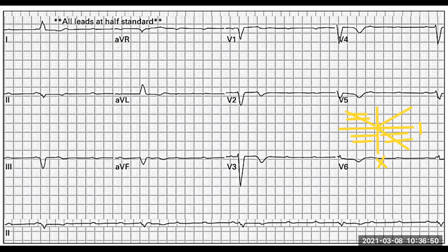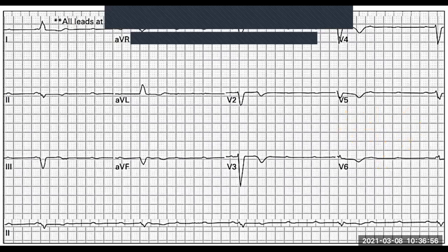So that only leaves us with one little option. So that means we've got a left-sided axis. All right, so that was the first thing. Now, the more important thing, let's look at the rhythm. We know we've got a bradycardia with the left-sided axis. So this tells us that either something's happened on the right-hand side, so all the electricity shunted to the left, or that the left side has become larger. Okay, but anyway, let's have a look.